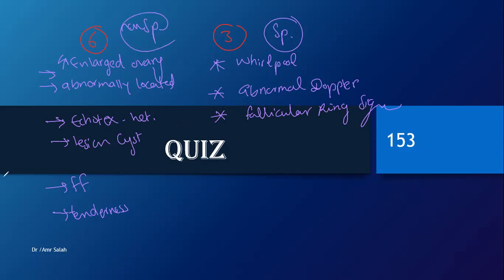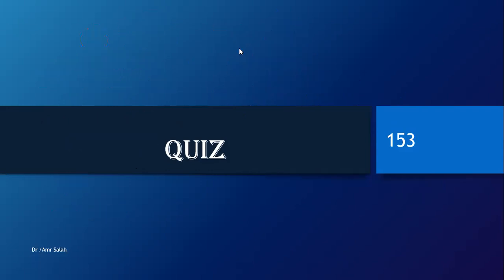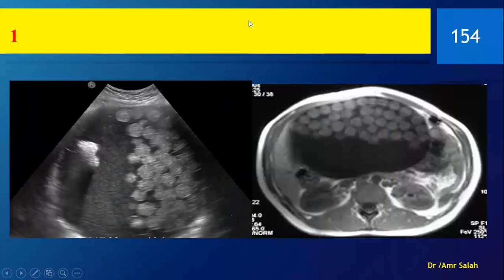Now you can take your breath. Take a very deep breath. We've finished, and we take a nice quiz. Try to test yourself and see how many you get right. Okay, let's start. How about this one? This is rather specific. This is a dermoid. Bravo. Give yourself a note for every correct one. I'm sure you get so many.